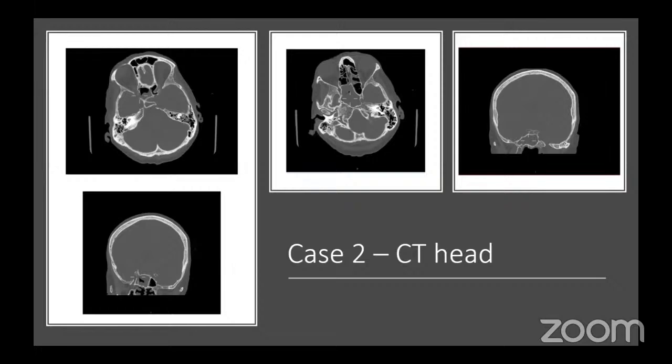And in this axial image, there is a bony dehiscence in the posterolateral wall of the sphenoid sinus with some aeration. And in this coronal image, in the same area, that's the bony dehiscence, which is the superior orbital fissure and in continuity with the optic nerve area. So there could be a chance of fungal sinusitis.